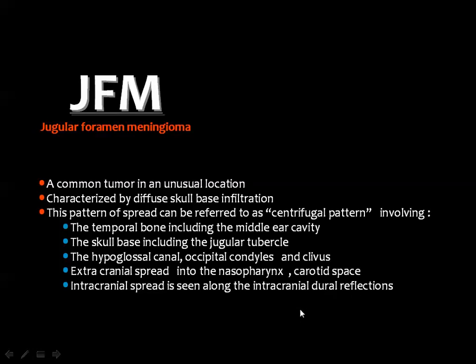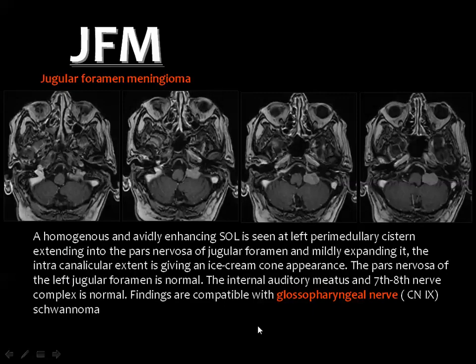I have presented some of the cases similar to what's written here, and if you look at these cases, you will never think of a meningioma, but you think of an aggressive lesion that is going in every direction. But on the pathology, it proved to be a meningioma. Then you consider also meningioma if you see an extensive lesion like this involving the skull base.